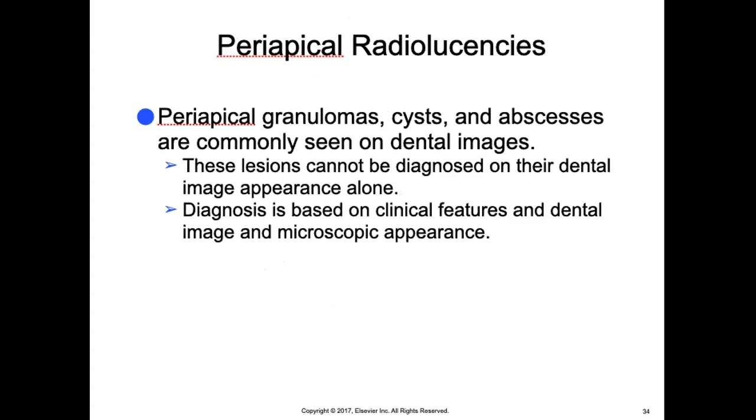Periapical granulomas, cysts, and abscesses are commonly seen on dental images. These lesions cannot be diagnosed on their dental image appearance alone. Diagnosis is based on clinical features and dental image and microscopic appearance. So a definitive diagnosis can be established only with microscopic examination.